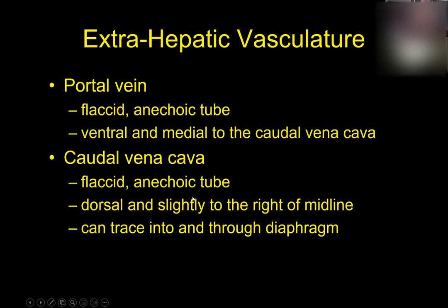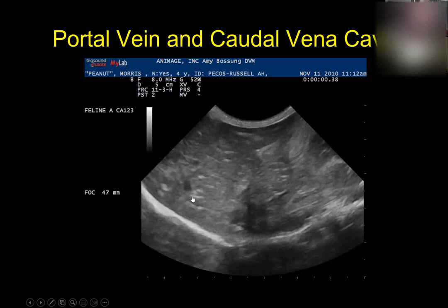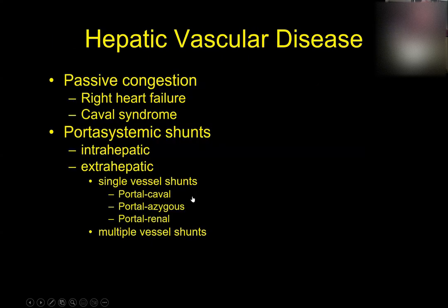Okay, so let's see. I'm going to get past a couple of pictures here. That's a really crappy picture. I need to put another one in.